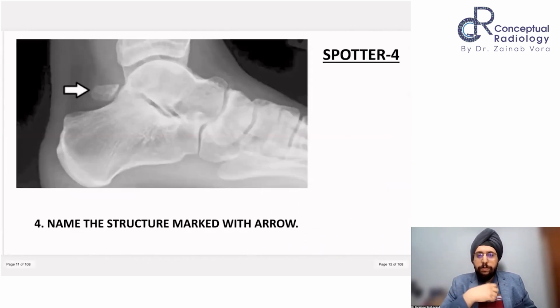Now you just have to name the structure marked with the arrow. So the first 3 were a little difficult. Now we are moving on to certain easy ones.